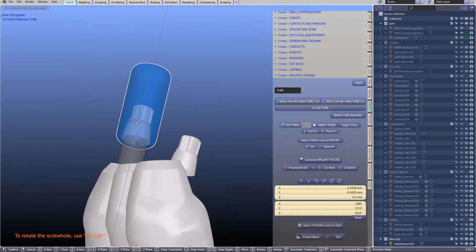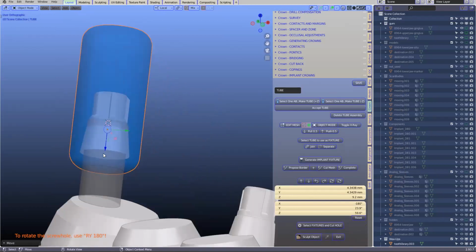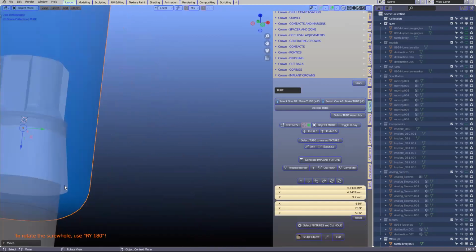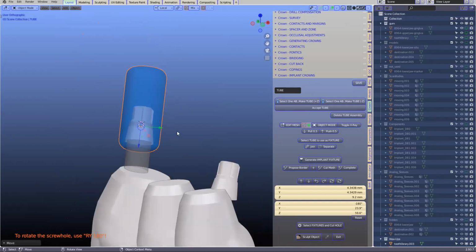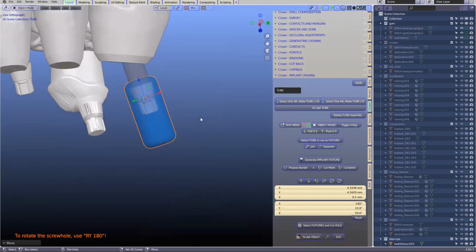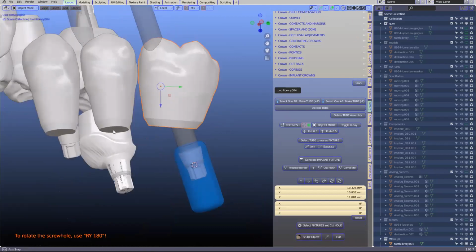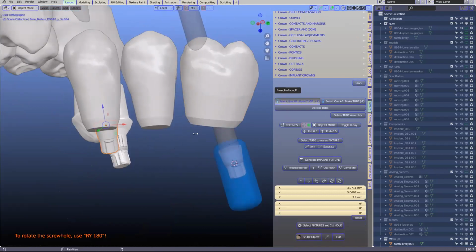If you move it, Michael, do you change the thickness of the layer of the tube? No, the thickness stays the same. What it's measured is 0.6 millimeter from this edge to that one there. So if you move it, it still remains 0.6. Okay, now we've got that, and we want to do exactly the same thing. So I'm going to head here. Now, actually, we'll do this one as well. You're doing both at the same time.